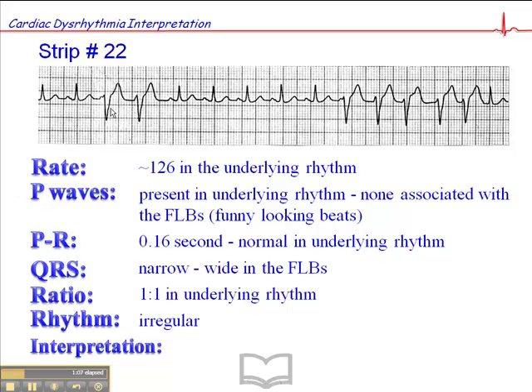And when you see two premature ventricular complexes side by side like this without a sinus beat in between, we call that a couplet, right? A couplet. And when you see three or more ventricular beats side by side with a rate at least 100 or greater, we call that a run of ventricular tachycardia. So we have a run of VTach over here. And the heart rate here is 150. So we have a VTach with a heart rate of 150.